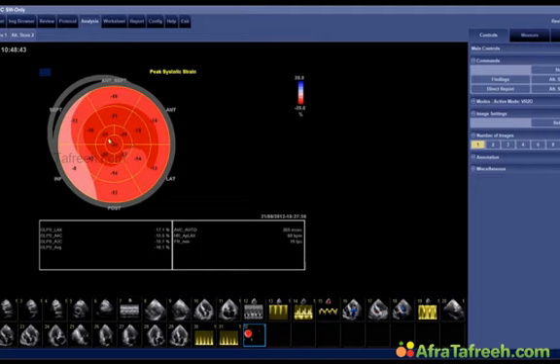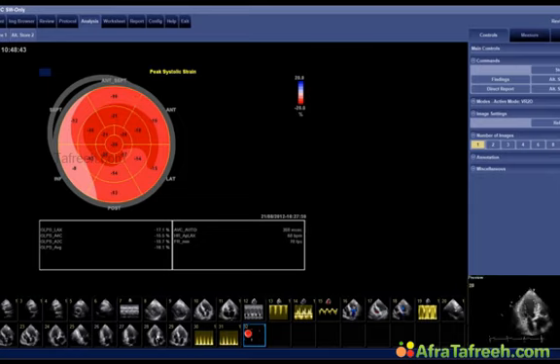So how do we put all this together? Well, basically what happens is that usually we have left ventricular function which is still preserved here in the apex, but deteriorates in the basal segments. The question now is, what do we do with this patient?